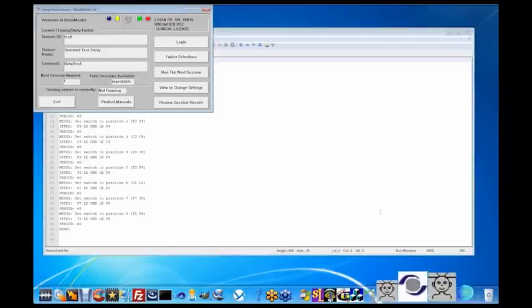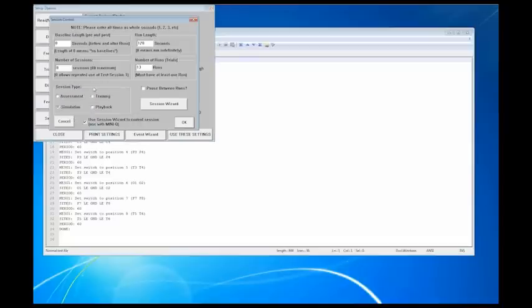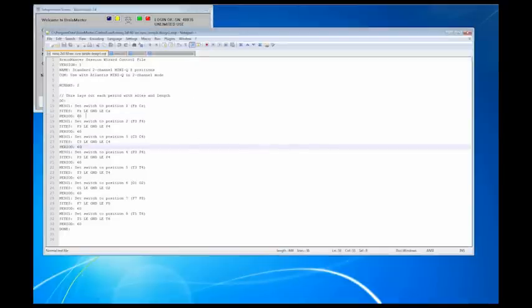If I open up the 3.0 software, go to my viewer, change settings, and go to session control, right now I have a run length of 120 seconds and I'm doing 13 runs. Off the top of my head, that's 26 minutes. That's what I'm saying right here. But by saying use SessionWizard, I'm saying forego all of that. What I'm worried about is how long I'm running here. So this session is going to run a total of 8 minutes as opposed to that 26 minutes.